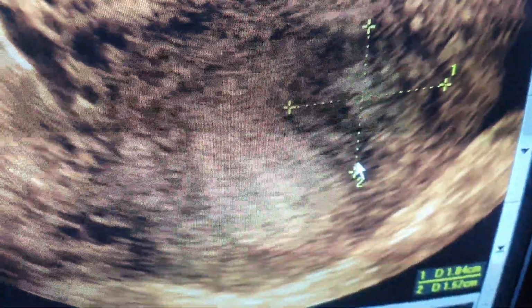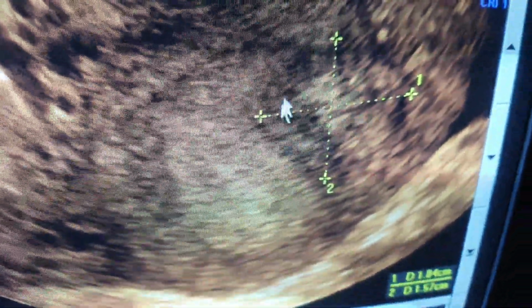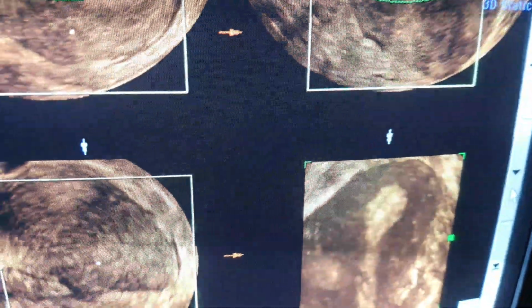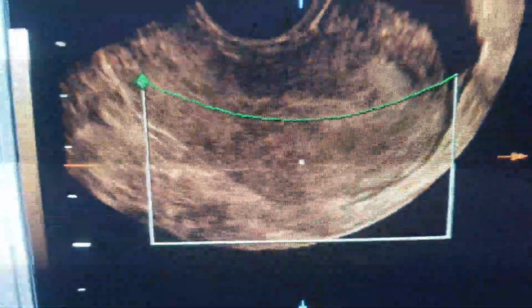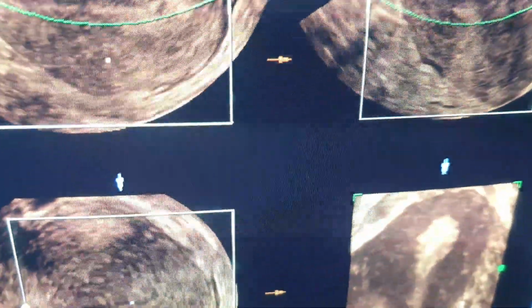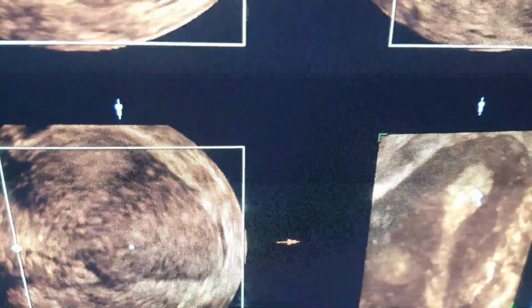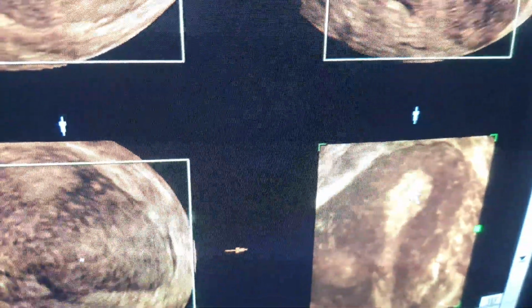And of course, you may diagnose it as a myoma, for example. This is the endometrium, and so you may think of this as a myoma, and this is not actually. And when you do the 3D ultrasound again, you may find this picture. You can see here, this is the 3D orthogonal planes, and of course the active is the A box, and so you may think of unicornuate uterus. And of course, this is abnormal. This is really abnormal, this is not the normal endometrium, and so you think of a unicornuate uterus.